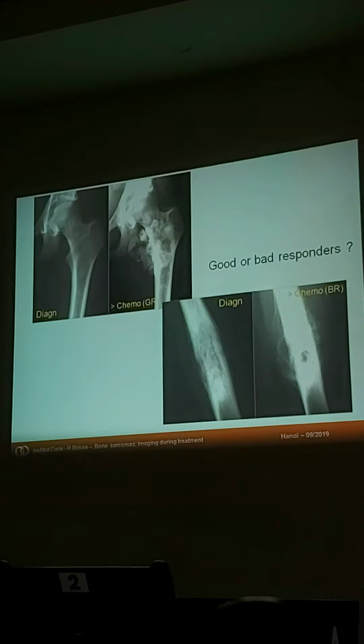Và thầy cũng nhắc lại là bác sĩ chẩn đoán hình ảnh không thể trả lời được trên phương diện hình ảnh đơn thuần là cái tổn thương đấy là đáp ứng tốt hay đáp ứng không tốt. Ví dụ trường hợp thứ nhất là trước chẩn đoán, khi chẩn đoán thì là có một cái tổn thương ở cái phần mềm như thế này. Trên X-quang thường quy thì sẽ không thể hiện được ra, nhưng trên cộng hưởng từ thì cái tổn thương phần mềm nó tương đối là lớn, và sau điều trị hóa chất thì chúng ta thấy là cái tổn thương phần mềm nó được vôi hóa rất là nhiều, rất là rõ ràng, và cái bệnh nhân này thì là ở cuối quá trình điều trị thì được coi là đáp ứng tốt.